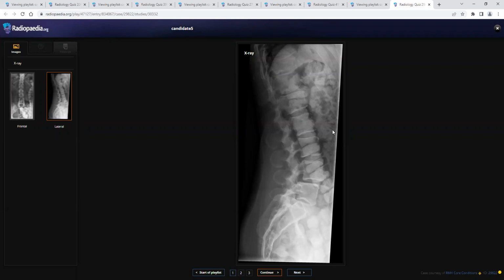So I can see that there is some evidence of spondylolisthesis of L4 over L5 vertebra anteriorly. Apart from that, the bowel is very hyperdense, the one which is containing the contrast. This is not helpful, so mostly go back to the AP frontal.